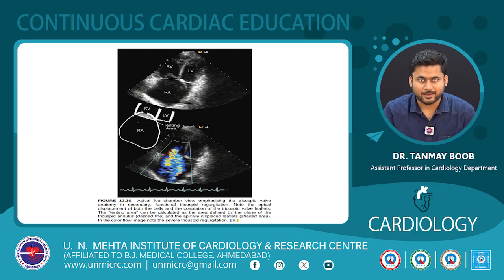As shown in the diagram, apical 4-chamber view emphasizing the tricuspid valve in secondary TR, which is the functional TR. Note, as you can see, there is apical displacement of both the belly and the coaptation of the tricuspid valve leaflet. The tenting area can be calculated as the area defined by the plane of the tricuspid annulus, shown by the dashed line, and the apically displaced leaflet, the shaded area. In the color flow, you can note the severity of TR originating from the tenting area.